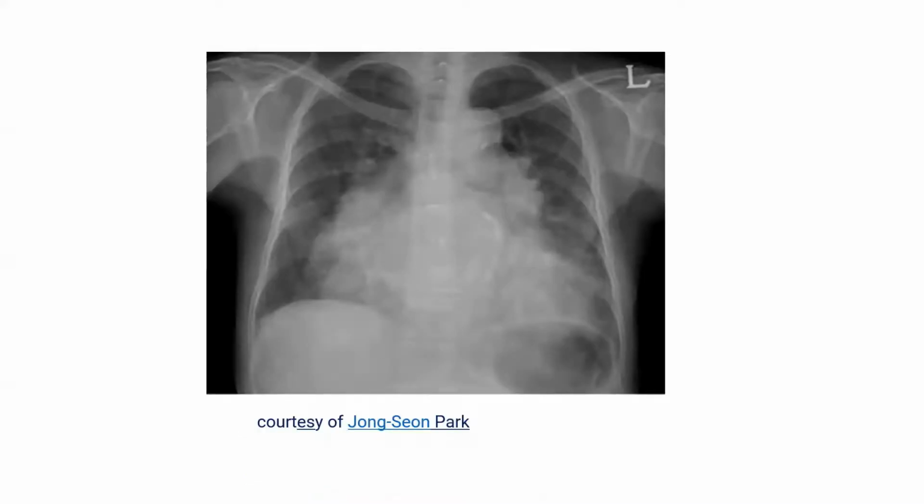And any guess? Maybe aortic aneurysm with calcification. Aortic aneurysm with calcification. Okay. Yeah, I wouldn't say you are wrong, because the aorta comes posteriorly, so it might appear this way. Good guess.